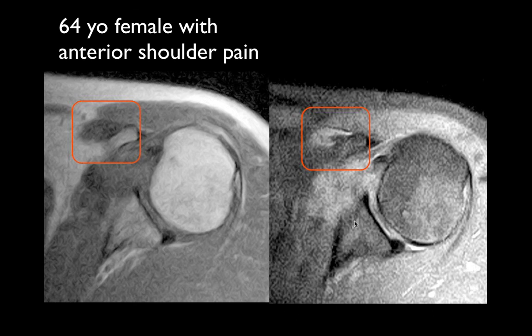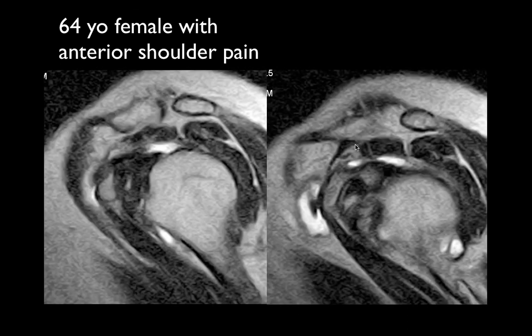Okay. You're talking about this area in here. And quite frankly, yes, that's right. Looking at these images, I'd have to agree with you, but I don't remember the other images up and down. In this particular case, what I'm concerned about is what do you think this area of abnormality out here is, adjacent to the coracoid process? I have to admit, I'm not certain.